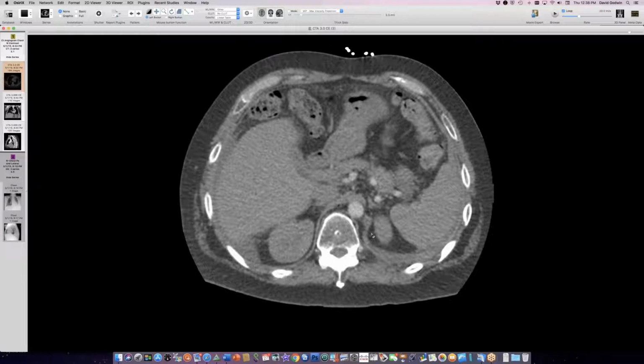So I'm bringing this up because not all of our radiologists here were aware of this possibility, but this is why diffuse pleural thickening can cause restrictive lung disease, because you can basically tether your diaphragm. So he's scheduled to have decortication early next month. So they'll go in and try to free up that lung. So this is trapped lung with a pleural process and diaphragm restriction.